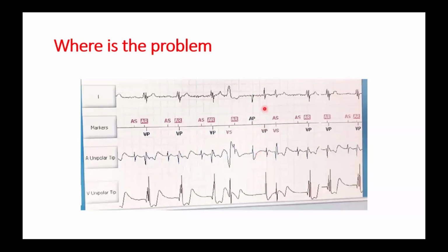But is this real ventricular paced? No, this is only a spike. And I think this is a QRS complex because it is a native one. If you look down, there is the ventricular electrogram down. So pacing firing spike in the ventricle not followed by capture.